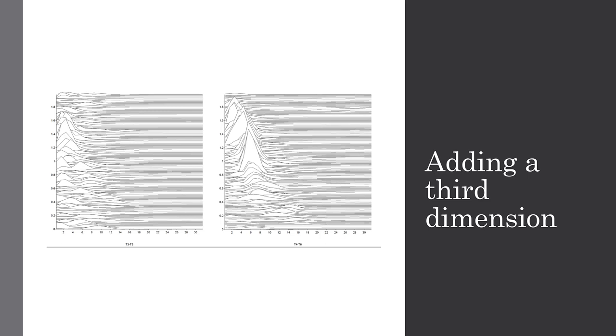This was the way it was done some decades ago, before computers could do high color and high resolution at the same time. But you can see here that there's power or amplitude at frequencies, and that's changing over time. So what we have is an evolving pattern here. We don't know if it's rhythmic or not looking at this. And it's fairly stable on the left channel T3, T5. So this is the way that FFT spectrograms were rendered back in the day.